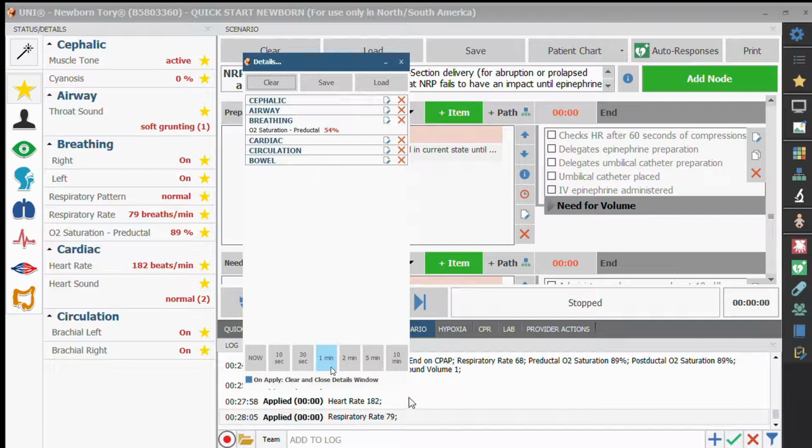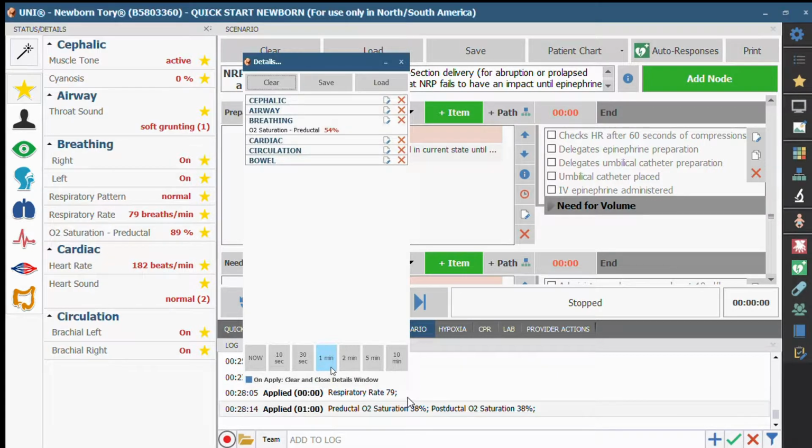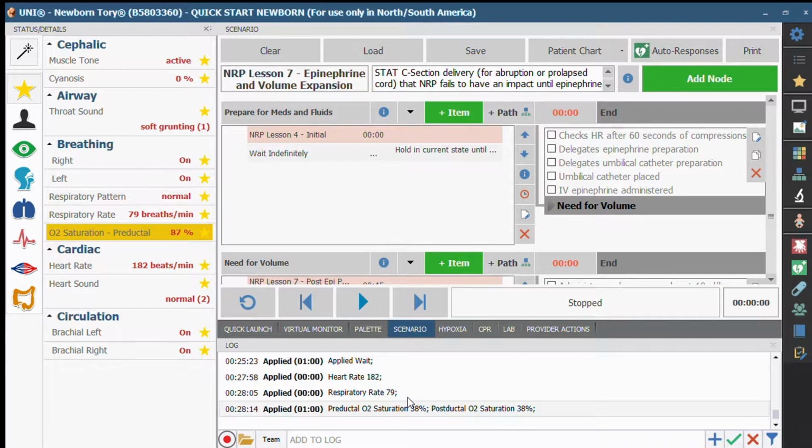I can have it decrease over 1 minute. So there is still some customization play, but hopefully you'll just be able to quick check through these boxes and Tori should do all of the things for you.